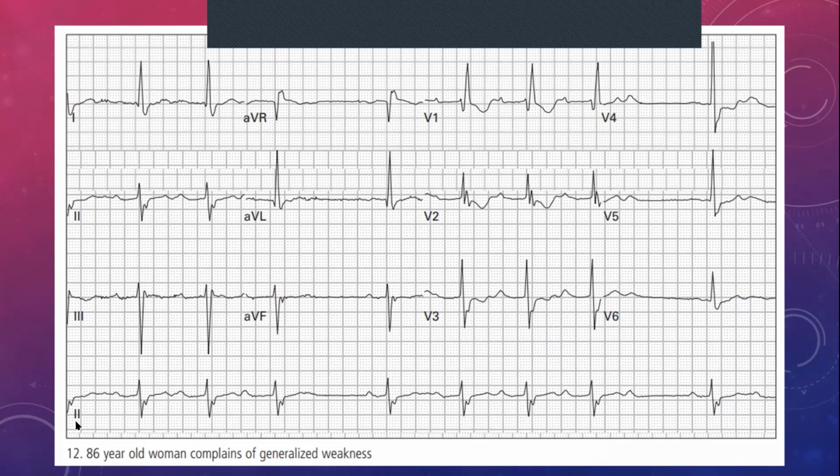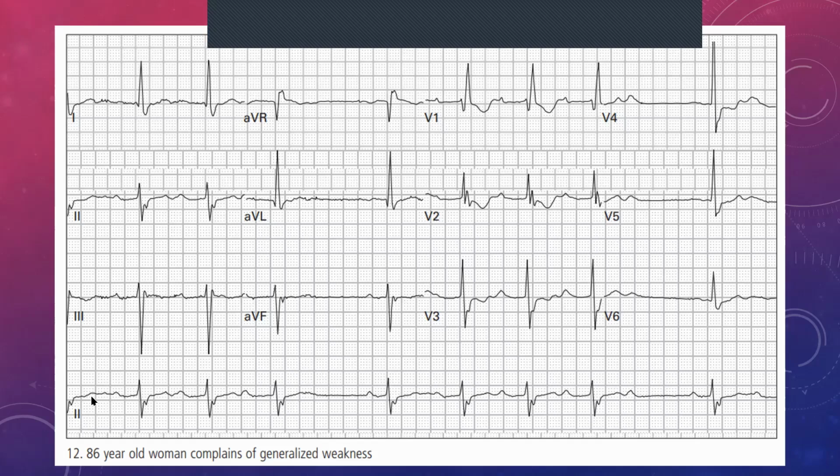This is one of the interesting parts. So let's have a look and see. Here we've got a P wave, which is our first step to analyzing whether we have a normal rhythm or not. When we look at the P waves, they generally look normal. There's one or two that are maybe poorly conducted, but the majority of them on the rhythm strip actually look quite normal, so relatively normal P waves.